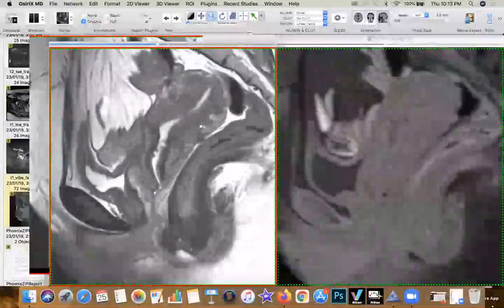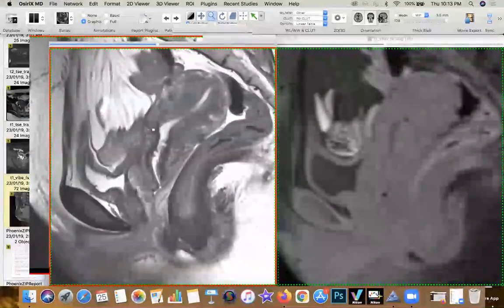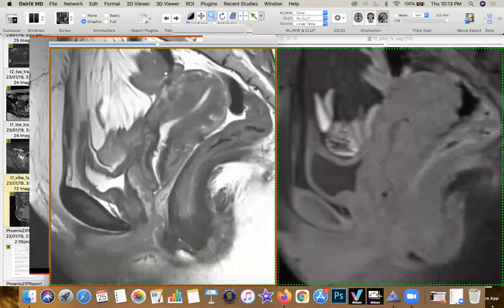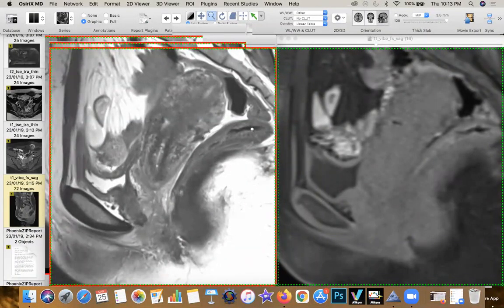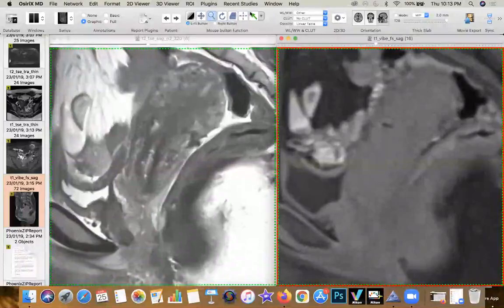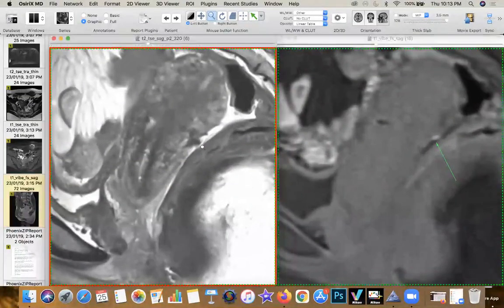Now, ideally, what would happen is when there's scar endometriosis, you would see T1 hyperintensity at this location, and then you would see the endometriotic tissue over the anterior surface of the corpus. But many a time we don't get to see that, and that typically spills over in the cavity, and usually it sits into the area of the rectouterine pouch itself. And now that's a classic location. And when I go onto the T1 weighted three-dimensional sequence, I start appreciating the involvement of the rectouterine, the anterior peritoneal reflection and the posterior surface of the corpus.